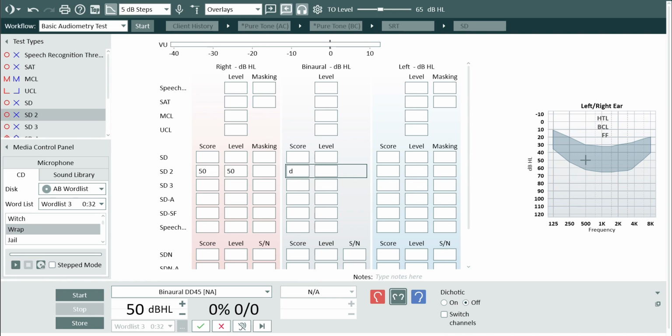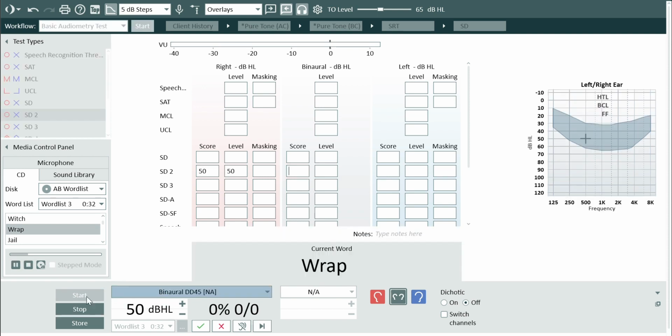You can configure settings, including keyboard shortcuts, for speech audiometry in the Tools menu. In this menu, select Settings, then Default Views to choose a graphical or numerical representation of speech audiometry results. Select the measurement standard along the left-hand side of the window to meet your country's requirements. Speech audiometry offset can be configured in Settings as well by selecting Speech Measurement under the Audiometry drop-down menu, again located to the left of your screen. Here you can also decide how you want to score the words from the word list.